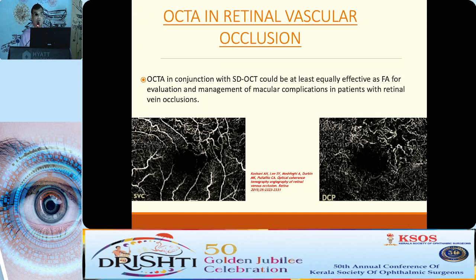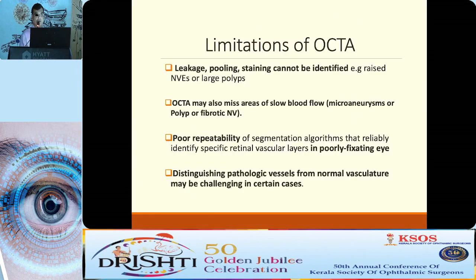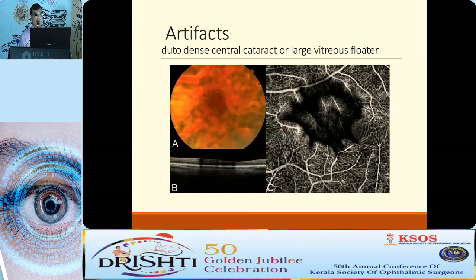You can see vascular occlusion, which my colleague will be covering later on. So the limitation is that it cannot detect leakage, pooling, or staining. OCTA misses very slow flow signals or very fast flow signals. Poor repeatability is there. Artifacts are there, which can make interpreting OCTA difficult.